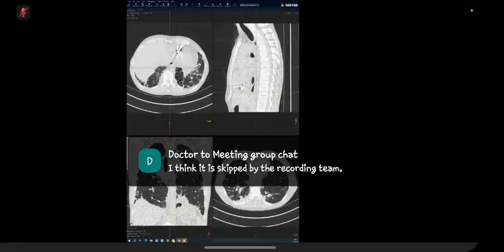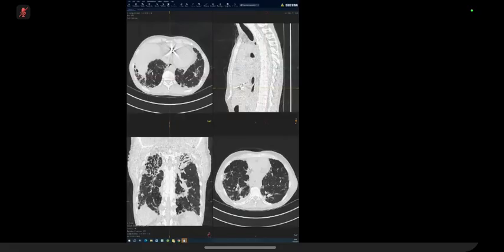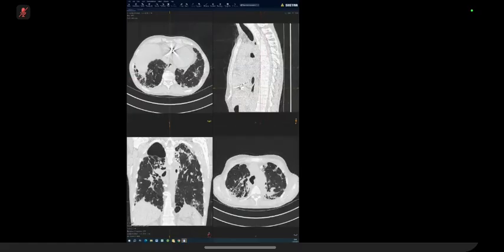When you want to say the bronchi are dilated in the context of fibrotic lung disease, you don't say bronchiectasis, because when you say bronchiectasis, it means primary bronchiectasis. You want to say traction bronchial dilatation every time. So this is upper zone fibrosis with traction bronchial dilatation and honeycombing. Is there something specific about the pattern of fibrosis? Is it more anteriorly or more posteriorly? It's more posteriorly. Do you know which disease does that?